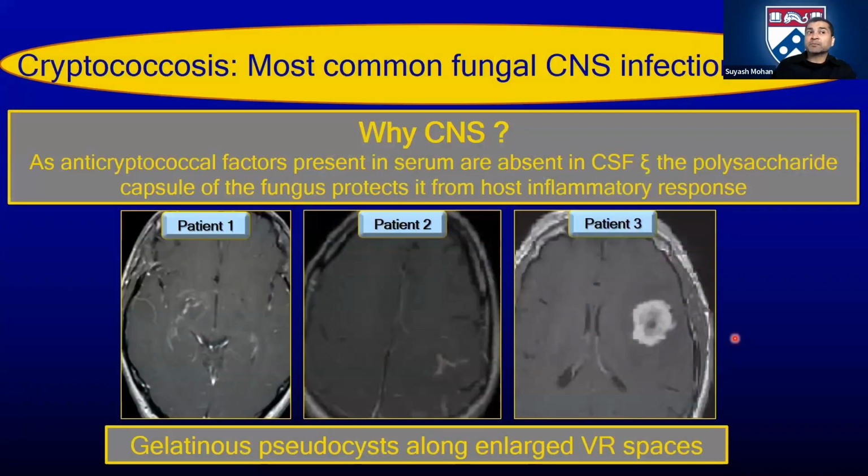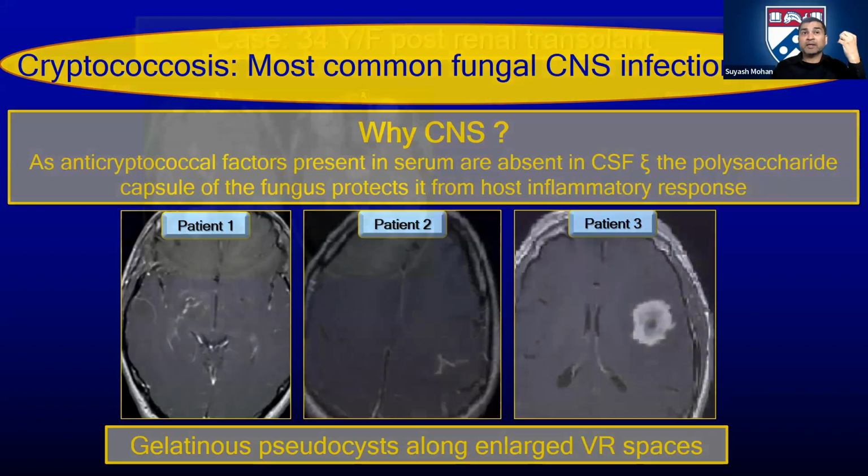These patients can present in different ways. So this is an example over here where the enhancement along the perivascular spaces was unilateral, right? Nothing on this side. This is difficult. This presented with focal meningitis. This presented as a giant mass, and this was actually confused for a GBM, right? This is difficult, but something like this and the previous case, bilateral symmetric appearing enhancement, should be easy to diagnose.